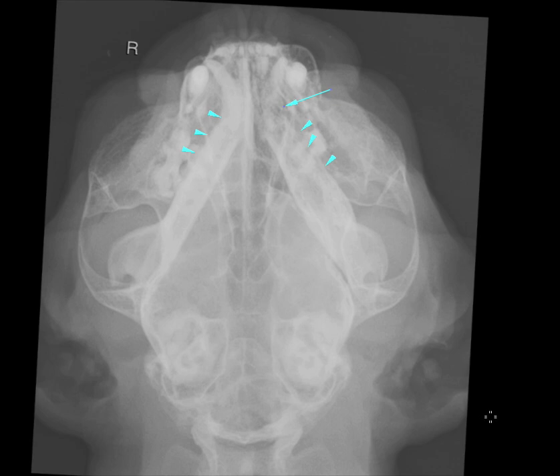So now I'm back to questioning, is this because there's obliquity? We already talked about the mandibular position being one of the ways we can tell there's obliquity on this series. Or is there pathology here, something causing bone lysis? Especially when it's centered at the root of the tooth, as it is here, I can be concerned about something like osteomyelitis secondary to tooth root abscess.